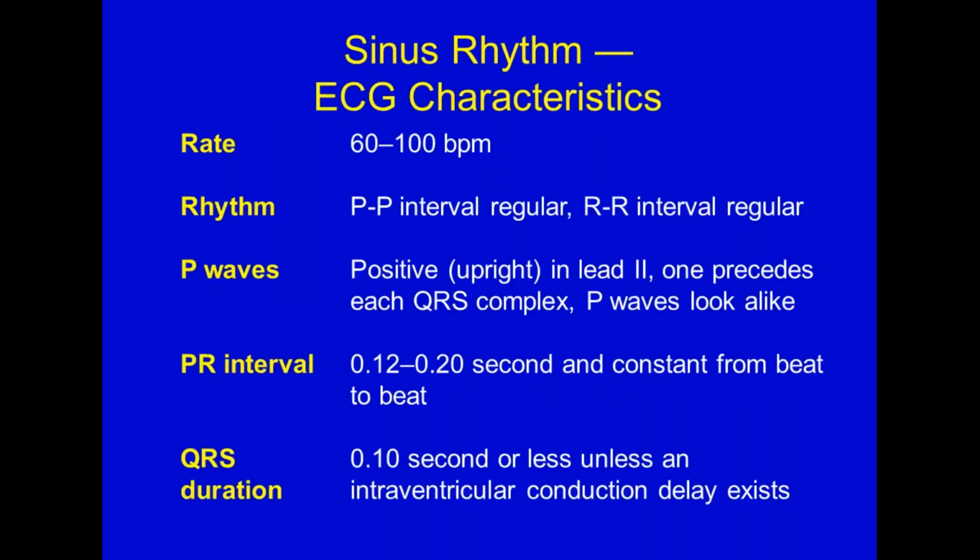So there it is. There's all the characteristics, and that's what I would really try to get hammered down in my brain. The QRS duration, that's just the QRS, right? Mm-hmm. So I thought you said a normal one is about 2 to 3 boxes. That would be little boxes. Oh, little boxes. Right. So 1 box is 0.04. Okay. That's good. Yep.